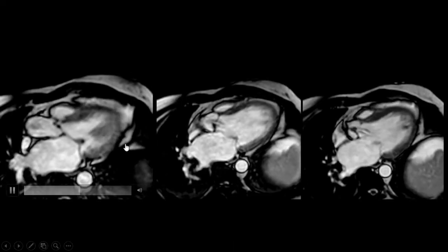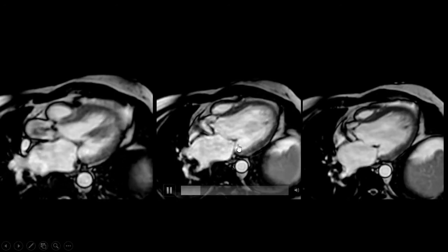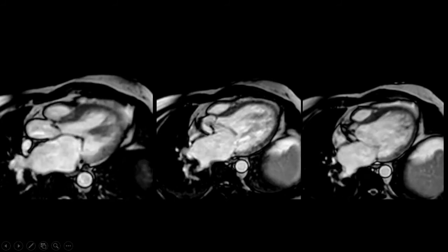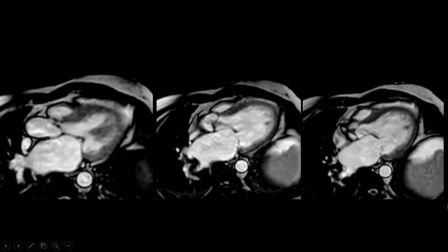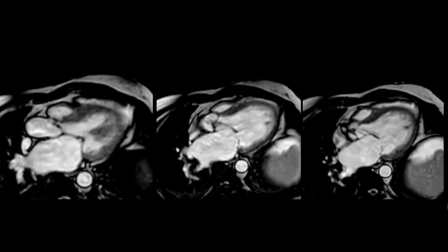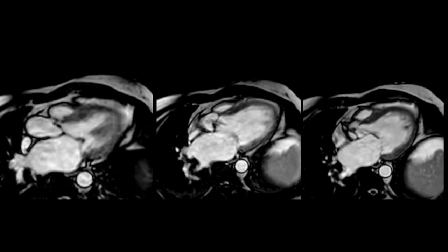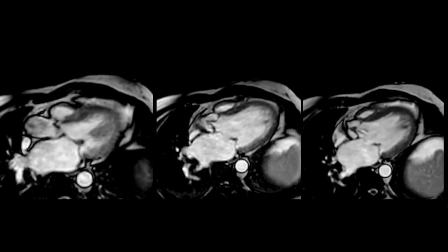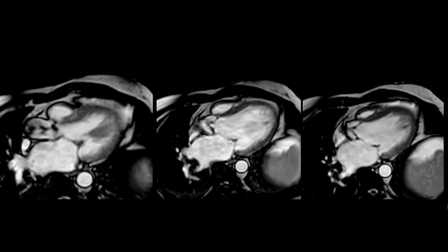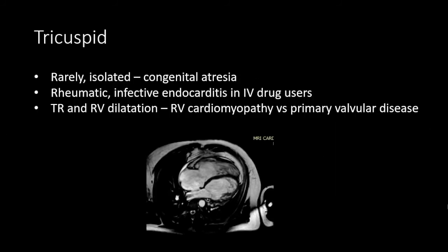So when we cut across in this manner, we get views like this. So this is the A1 P1 scallop, A2 P2 scallop and A3 P3 scallop. So we get views with opposing scallops, which helps us to determine if it is a localized lesion rather than an entire valve disease, which can be used for just localized repair of the scallops instead of entire valve replacement.